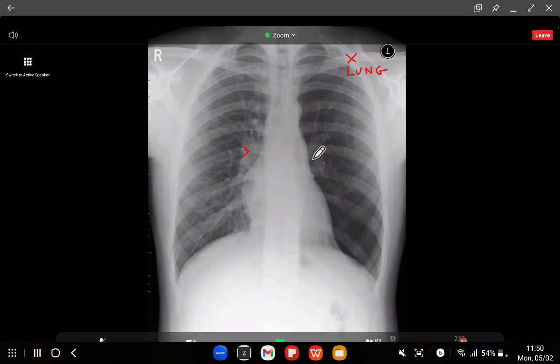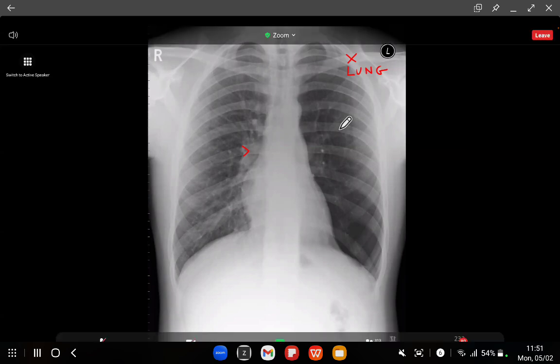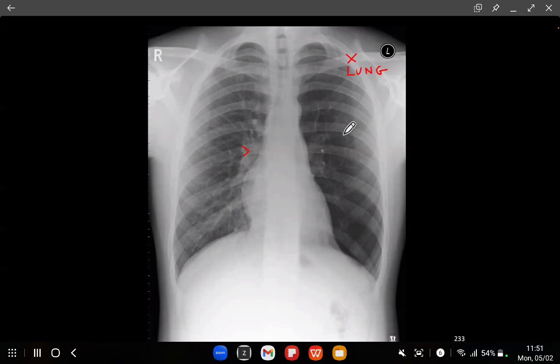And that's pretty much in keeping with the diagnosis. It's really, really important, though, to notice that when you do the expiratory view, that is not the end of the story. You do still have to exclude an endobronchial tumour, because endobronchial tumours can actually cause air trapping of this magnitude, especially something like a carcinoid tumour. So you can't diagnose Swyer-James syndrome just on the chest X-ray appearances alone. You have to get a positive history of bronchiolitis as a kid, and if you don't get that, you need to explore further the fact that they don't have an endobronchial tumour.